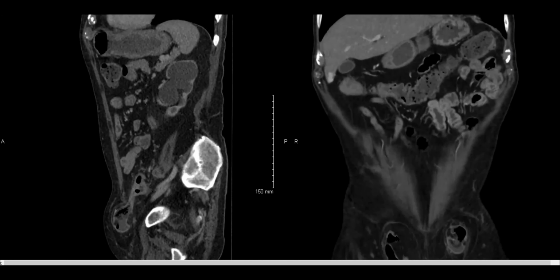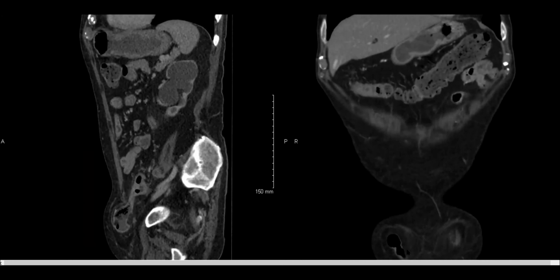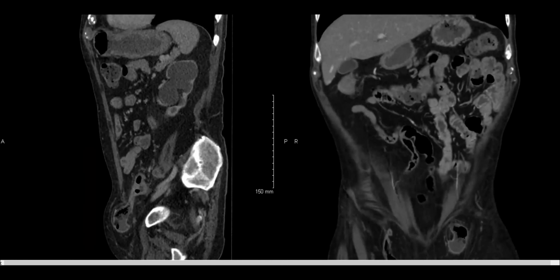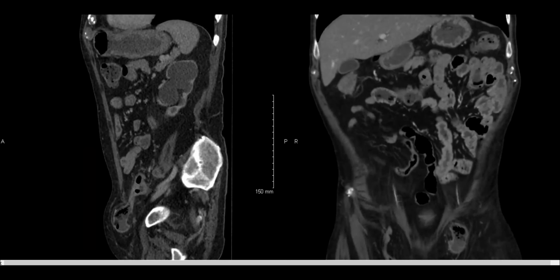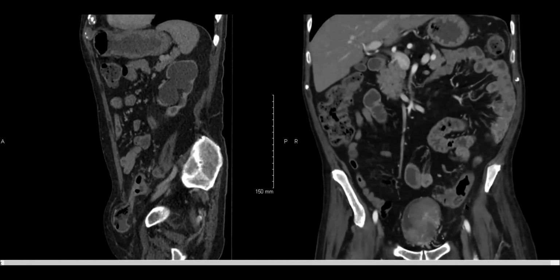It's just an elongated blind structure. Here again, we see two loops coming in, then forming a loop and coming out. Here we don't. We see one neck coming down, and again, if you're reading quickly, it's not an easy case. So anyway, it was interesting.